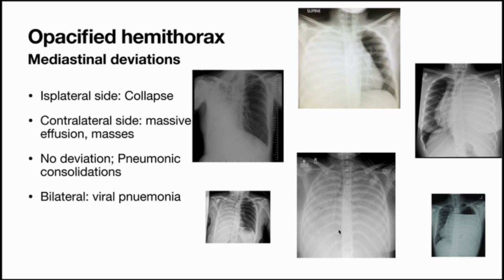Again, it is important to see whether there is air bronchogram or no air bronchogram, because in a pneumonia there will be air bronchograms. I think there may be some air bronchogram here. And of course, we also talk about the positive silhouette sign with the cardiac shadow. Then you say further investigation, the CT scan could give us more information, and so on and so forth. So in a nutshell, that's how you go about your reports.